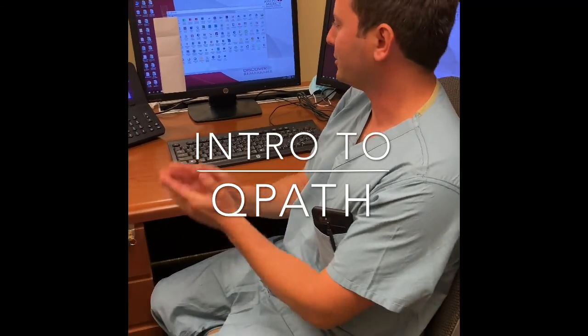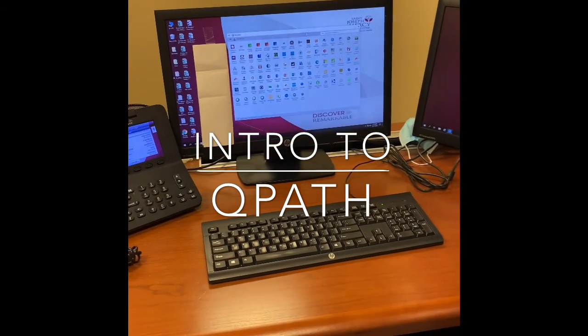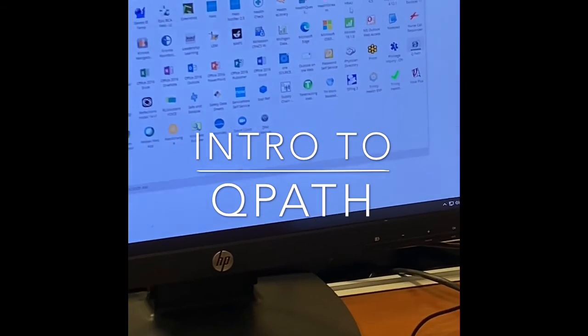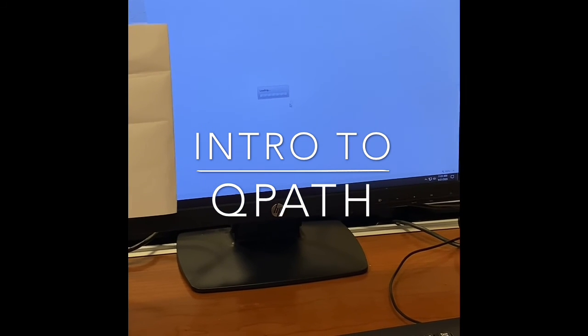So let's direct our attention to the screen. If you open up the apps portal here, one of the icons should be QPATH. If you double click QPATH, you have to wait for the application to load.